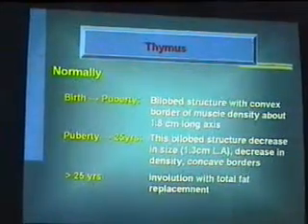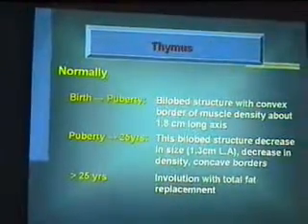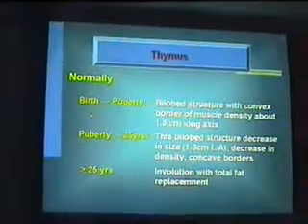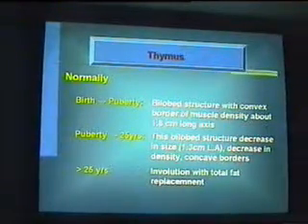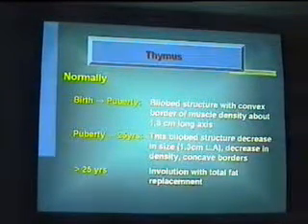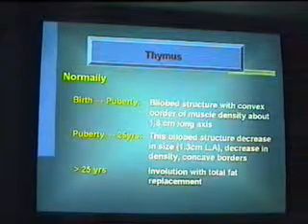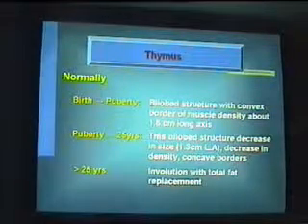نيجي لتاني حاجه الثايمس، والثايمس عليها كلام كبير كتير قوي. اول حاجه عايزاكم تعرفوا نورمالي الثايمس دي بيبقى شكلها ايه. We know that the thymus from birth to puberty بيبقى لها كيان، يعني there is a mass that is called the thymus. من البيرث واللي هو فاكرين السيل لايك appearance of the thymus في الاطفال لغايه البيوبرتي. عاده بيبقى عندها convex upper border.